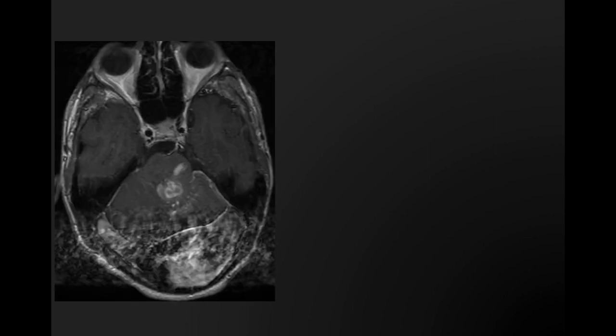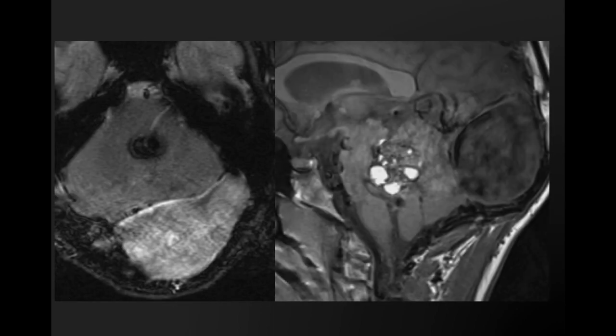And then you can see here they developed this new hemorrhage within the radicles of the DVA. And then on follow-up, you can see it has the classic appearance of a cavernoma. So essentially, the venous hypertension in this DVA, they just happen to be draining where this dural sinus malformation was, resulted in formation of a cavernoma.